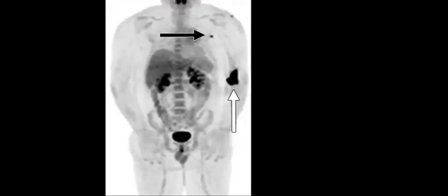No? No, Muhammad? Rabab, yes. So it could be injection site or extravasation. Yes, it could be injection site or extravasation.